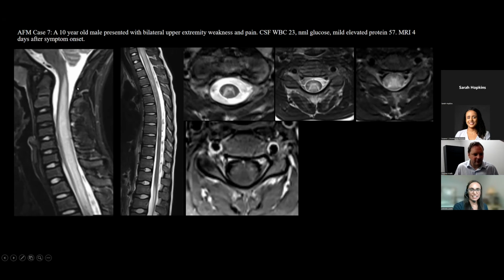So this is one that probably all of our med students can appreciate as abnormal. Going from the cervical spine into the upper thoracic cord, you see this T2 hyperintense signal. It's longitudinally extensive. This is a lot more than I've shown you on a lot of the other cases. When I go to the axial images, there are a lot of areas with more central gray matter predominance, as you see here. You see here, this is starting to get smudgy in the dorsal columns, a little bit in lateral. As you come down even farther, probably somewhere through this level.